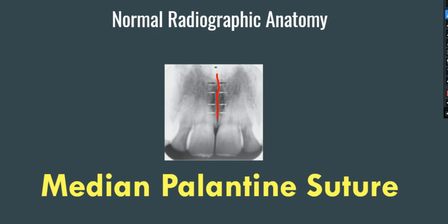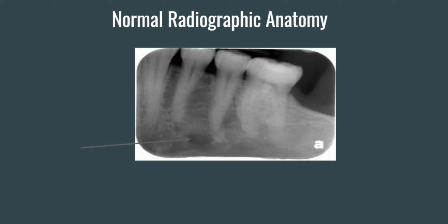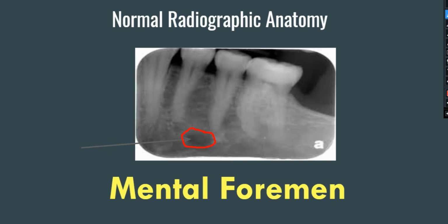Median palatine suture. Next, where this arrow is pointing, I'm going to circle the area that you're identifying. And that is going to be your mental foramen.